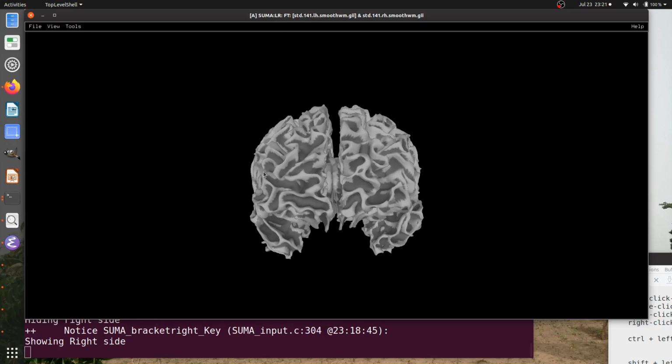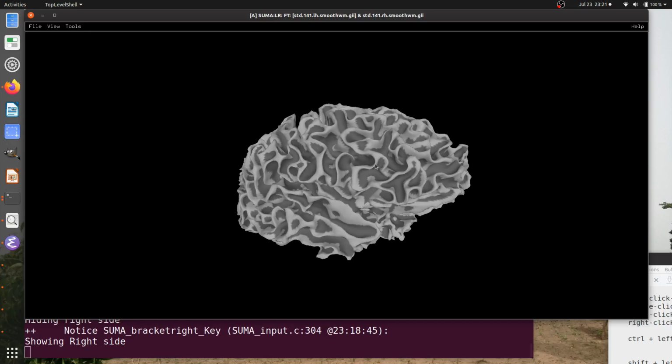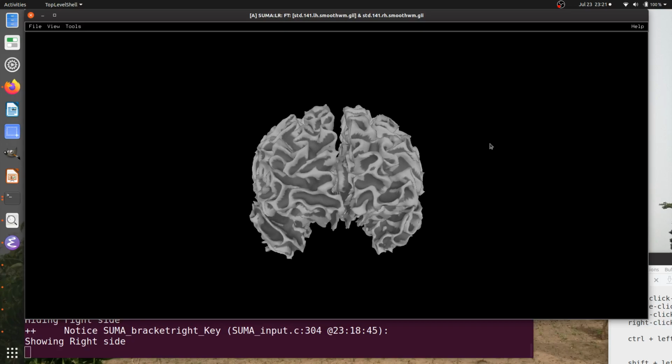And something we also have to remember is, what are we actually looking at here? So we've said this is a brain surface and we recognize it, but what part of the surface? A real surface has thickness. So this is actually the gray-white boundary. There are other surfaces that are estimated too. What about the outer part, or the pial surface of the gray?